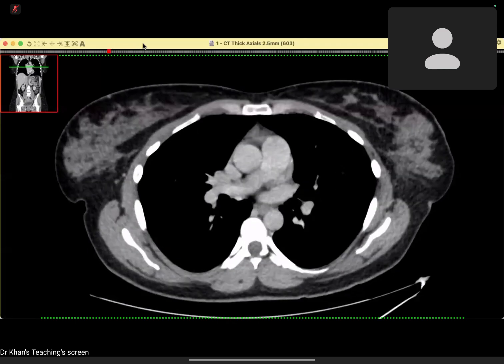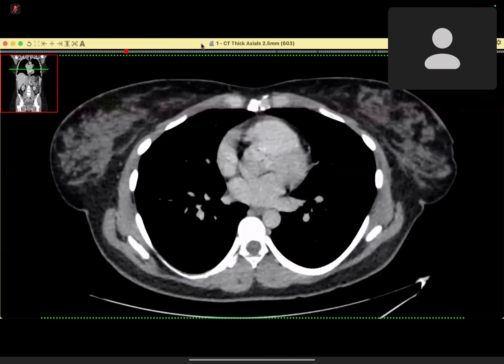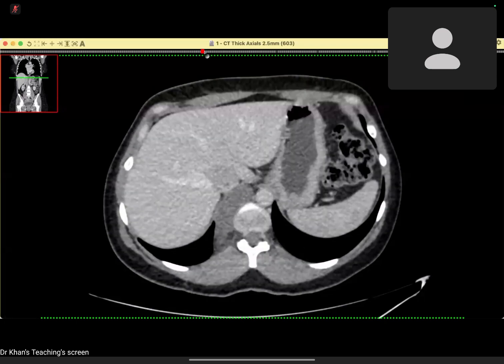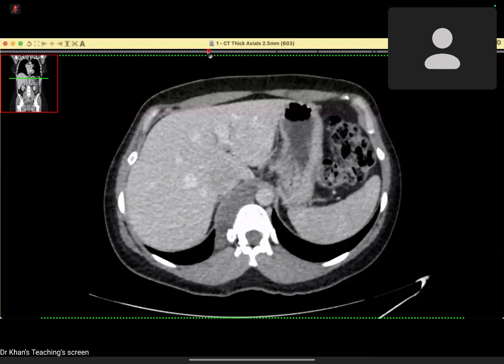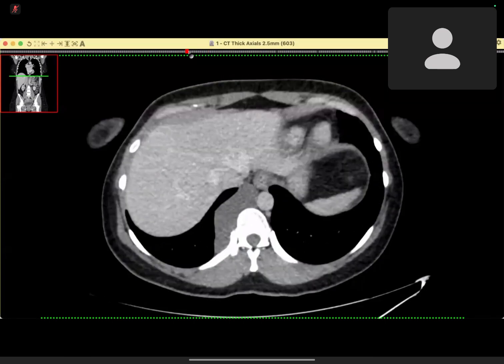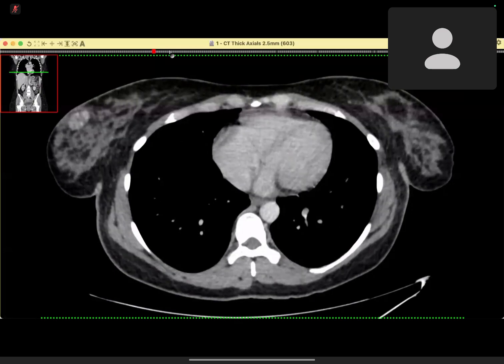This tissue density is extending over multiple vertebral levels, and it shows hypodensity in comparison with the muscle. I will compare with the non-contrast images for the enhancement. I don't see any obvious calcification in this soft tissue density.